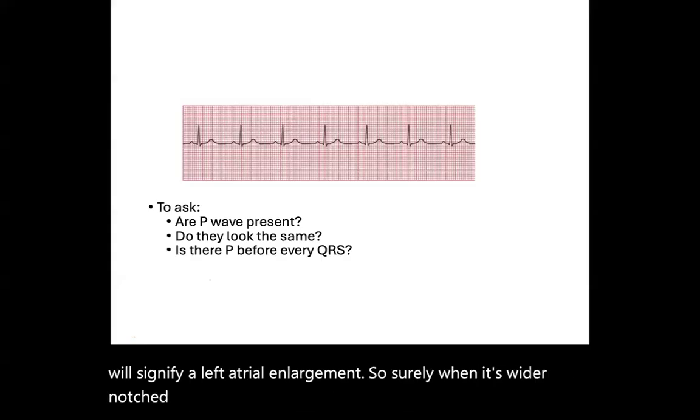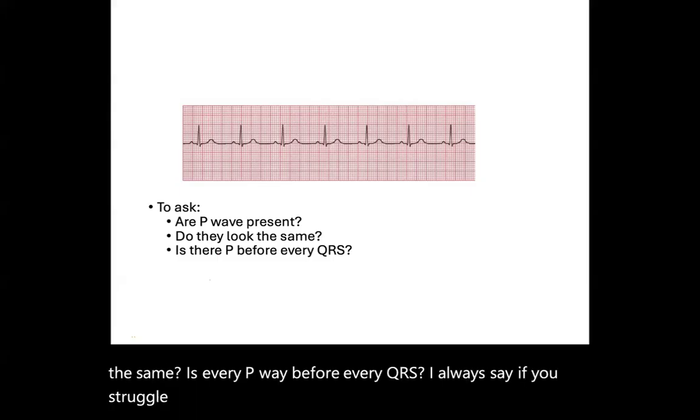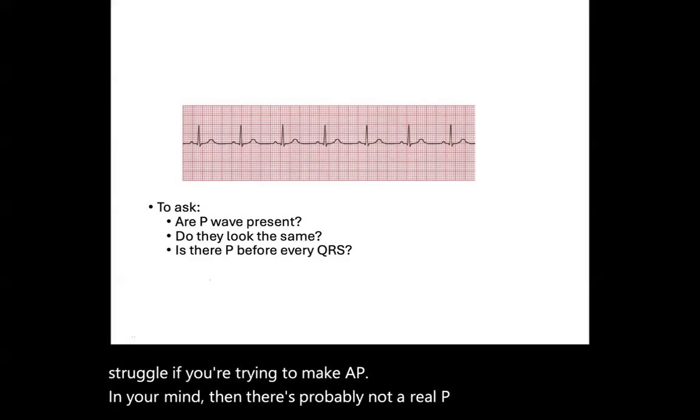Now, ask yourself, are the P waves present? Do they look the same? Is every P wave before every QRS? I always say, if you struggle, if you're trying to make up P waves in your mind, then there's probably not a real P wave there.